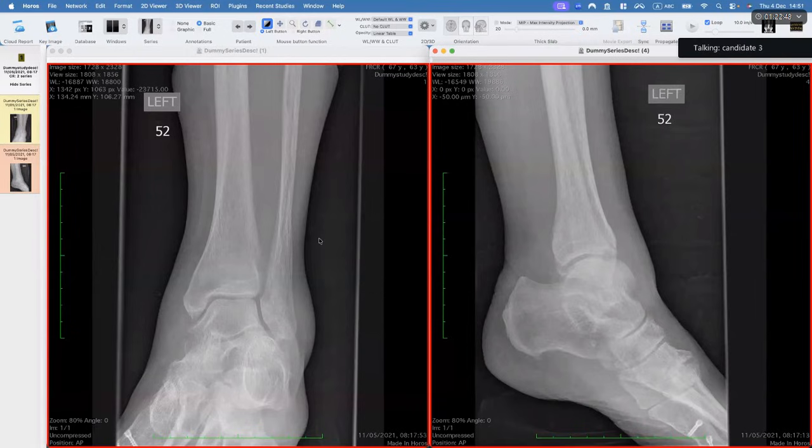Can I just focus more? I want also to check the joint surface is seen intact. The tibia and the fibula and tibiotalar joint are seen intact. There are changes seen in the cortex and the medulla of the distal end of the fibula.